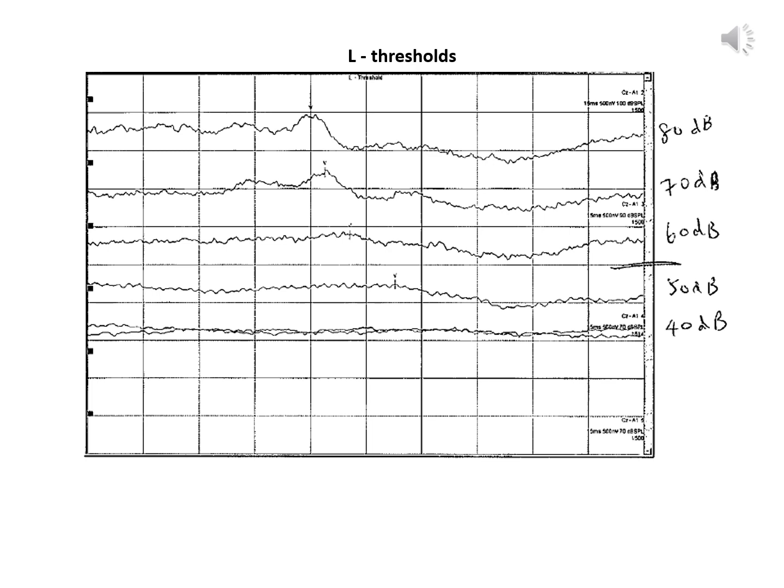And so that presents the stimuli at a very, very fast rate, and the technologist just needs to adjust the decibel level of stimulation systematically. And the recording that's obtained is what we see in this image. Initially, the patient is tested at a very loud decibel level, and then the decibel level is decreased by 10 dB with each recording. And what happens is that the waveforms within the evoked potential get smaller. They become of lower amplitude as stimulus intensity decreases. So the softer the stimuli, the smaller the responses.